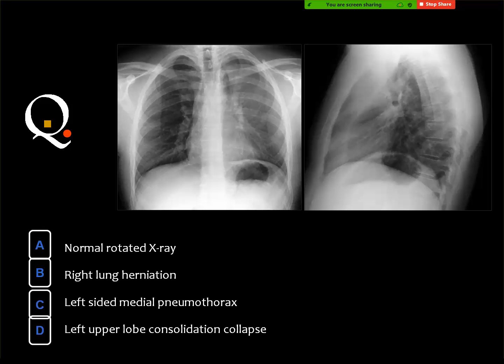Yes. And actually this is, to my mind, somewhat difficult, but if you see the lesions in the plain X-ray, you should favor the possibility of contusion more than the COVID opacities, because the COVID opacities are at the level of ground glass, and they are not clearly seen in the chest X-ray. Also, if you can see fractures of the ribs, this is in favor of contusion.